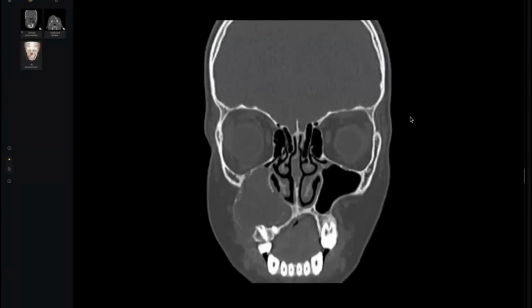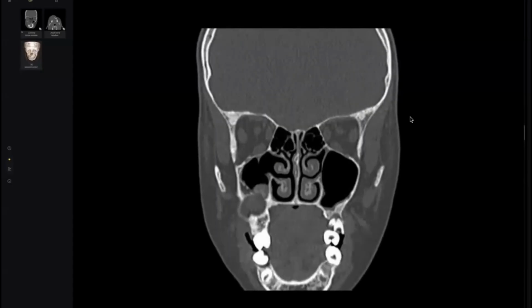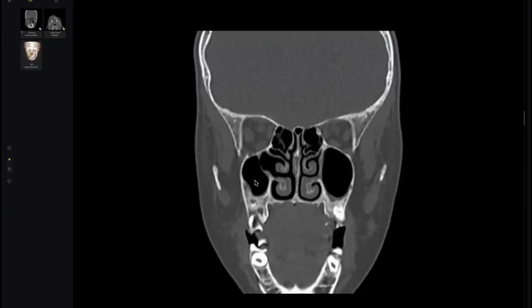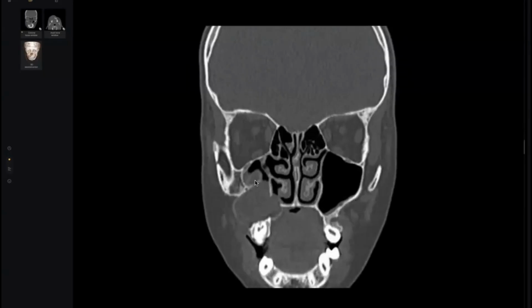With the thinning of the wall, first I thought of mucocele only in the coronal view, but in the axial view it appears to be arising from the maxilla, more closely related to it. Look here, the sinus is completely open. It will be closed in mucocele. Second, the sinus itself shows no expansion or remodeling of its wall. Thank you so much, doctor. You did very, very well.